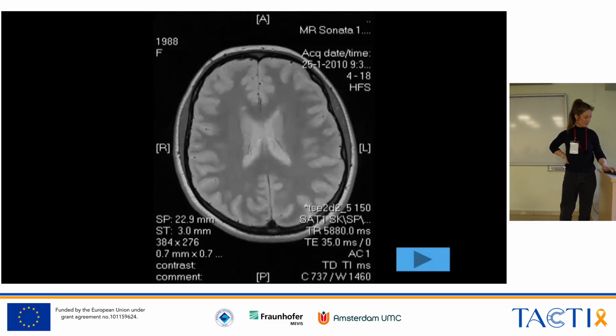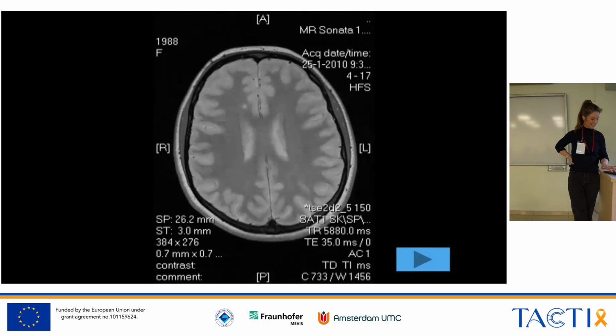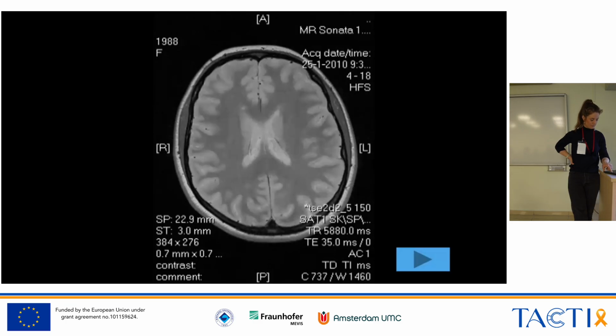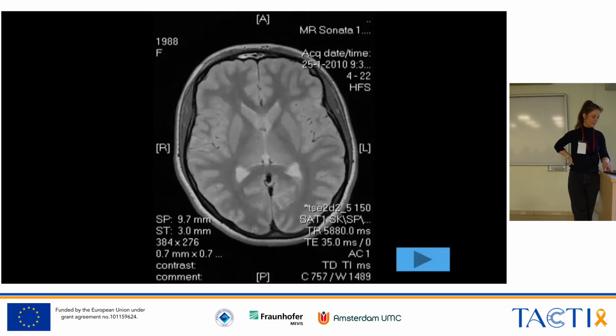Yeah, so first of all, I'm still not quite sure if this is a true periventricular lesion. It's probably touching the ventricle, but sometimes they are just very close. So we just have a paraventricular lesion. We have currently, with the old guidelines, not a dissemination in space. With the new guidelines, if we now see optic neuritis also in the MRI scan, we have dissemination in space.